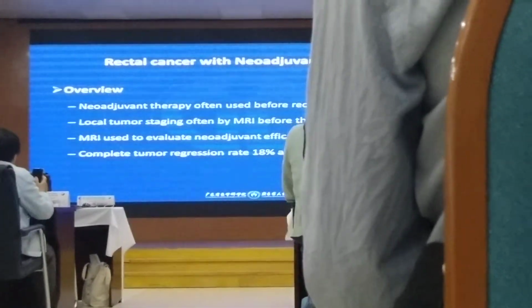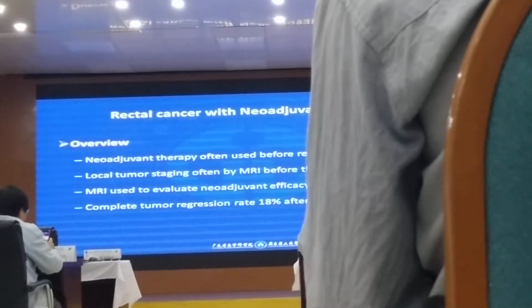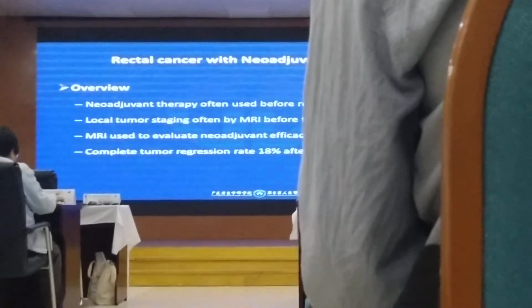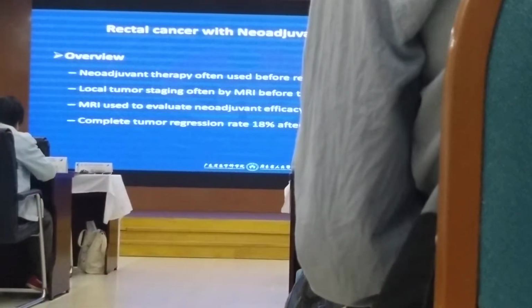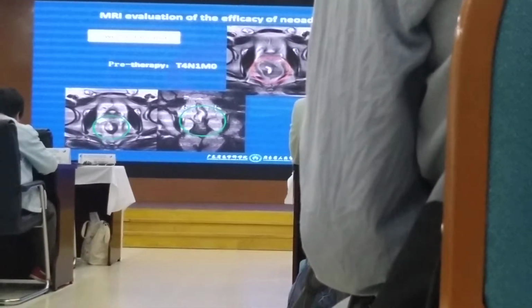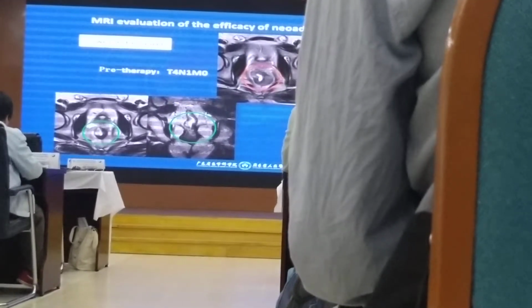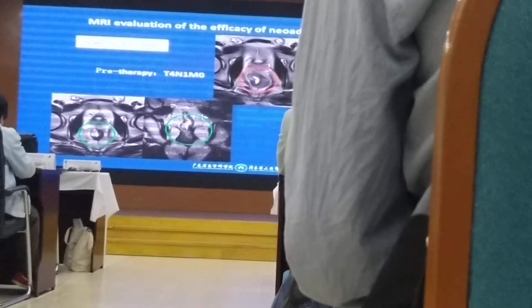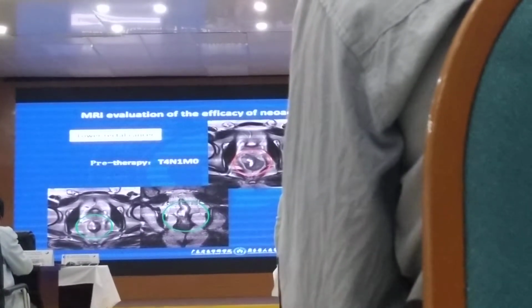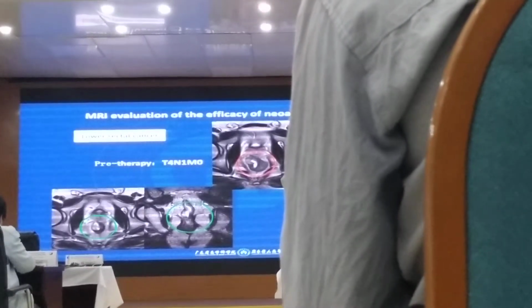According to the literature and our experience, MRI is useful to evaluate the lesion of CRC before and after neoadjuvant therapy. MR can effectively evaluate the response to the neoadjuvant therapy in patients with rectal cancer. For example, this patient's TNM stage decreased from T4N1 to T2N0M0.